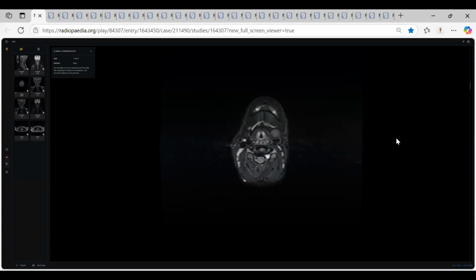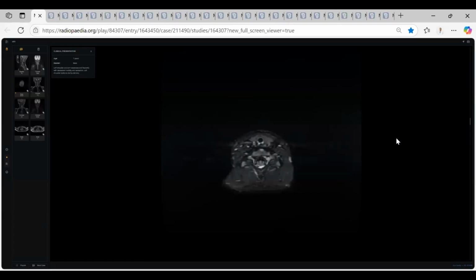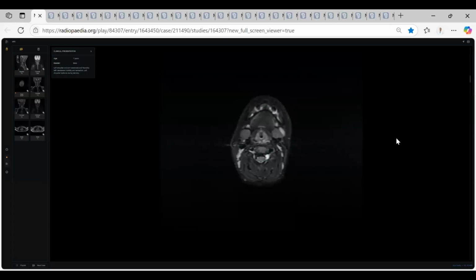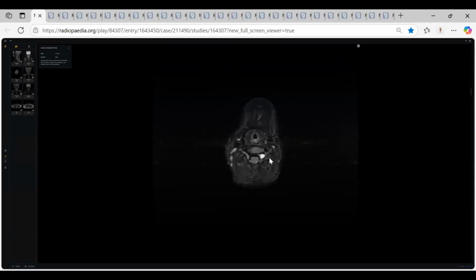The mistake you made is that you were searching in the dorsal region, until I told you: where is the pathology that you detect in the sagittal? The pathology is in the cervical region, so you should concentrate on the cervical region. Compare left with right, my colleagues. There is at least cystic dilatation associated with dilated foramina.